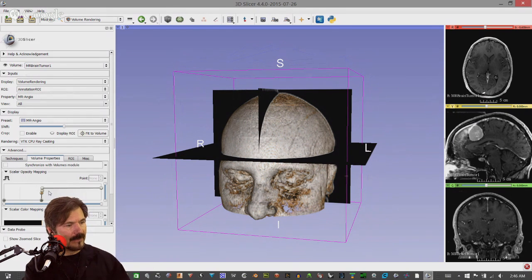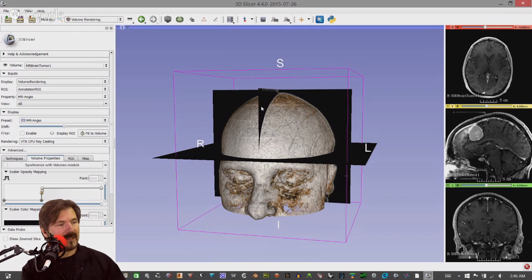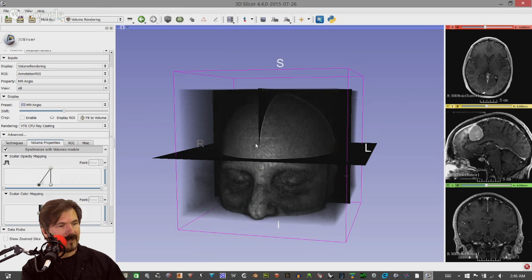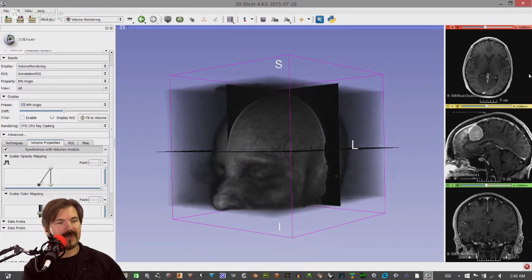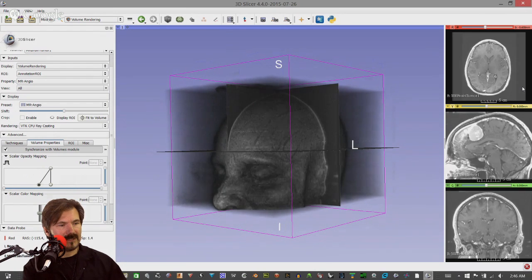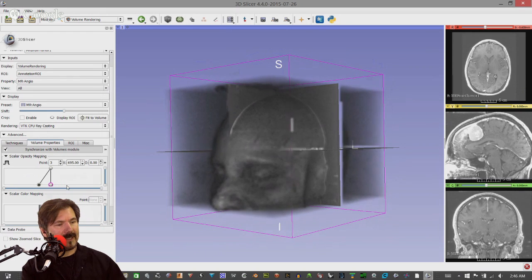So one of the things that we can do is start, if you can see this over in the, my head's in the way. Get out of the way. You can actually modify it. Well, one of the cool things that I like to work with right away is synchronize with the images over here in the volume. So watch what happens. It immediately changes color. And then notice that I have a haze around it. But if I go through and adjust this, notice it changes the colors that you see there. Can you see that, Javin? Yeah. Okay.